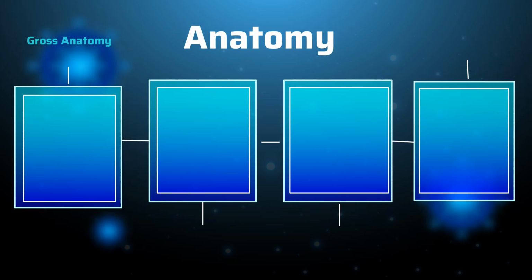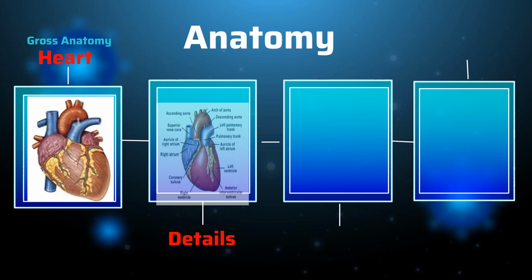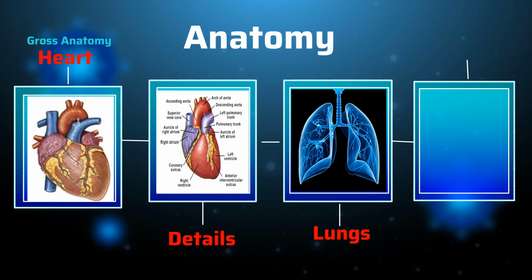This course will cover chest anatomy. Gross anatomy of the heart and its position in the thorax will be identified. The details of the location of the heart structures and their corresponding location on X-ray will be determined. Anatomy of the lungs will be visually noted, and then the integration and appearance on X-ray will be clearly discussed and identified.